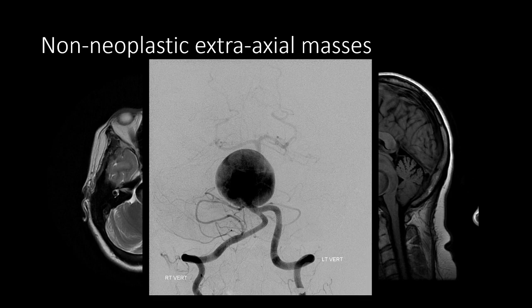Okay, so I'll just close with this case as a warning. Don't forget about vascular lesions and aneurysms, especially giant aneurysms, which can present as extraaxial masses and mass-like structures that compress local structures. And if they're first detected on an MRI, the diagnosis of aneurysm just might not come to mind. But always keep this diagnosis in mind, and when in doubt, add it to the differential diagnosis. Consider a CTA or MRA, and this is especially important to think of in the preoperative setting.